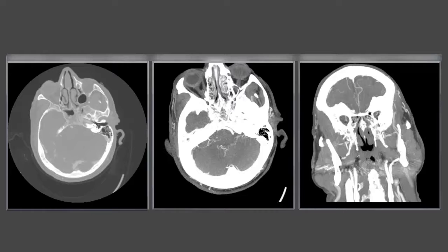So this patient came in with a left MCA syndrome, a right hemiparesis, and aphasia, and a left gaze deviation. So knowing this information, obviously our focus is on the left MCA territory, but we're going to have to remember to cover all of the vessels of the circle of Willis, all the large artery potential occlusions, as there may be more than what we're expecting.